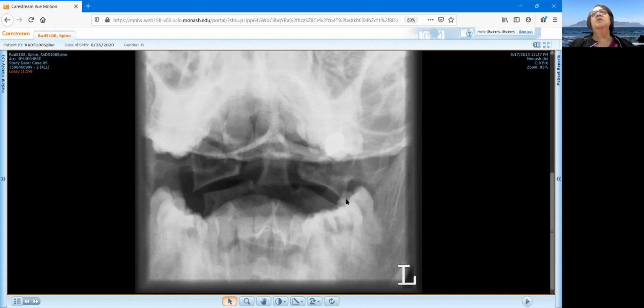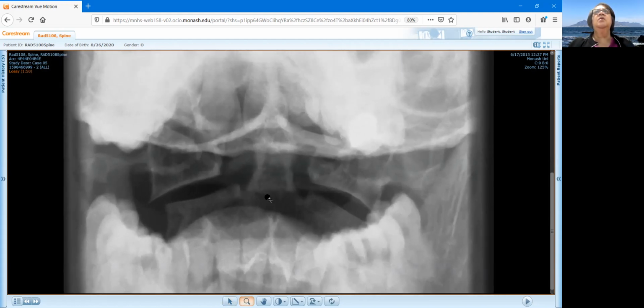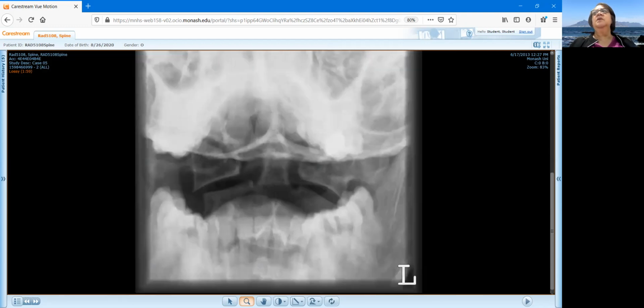If we look at how the lateral masses of C1 align with C2, the left side seems okay, but on the right side we can see that the lateral mass of C1 overhangs C2. It might appear as if there could be something going on at the base of the dens, but this is just the Mach effect. So there isn't a fracture at the base of the dens. You may have thought that would be the case.